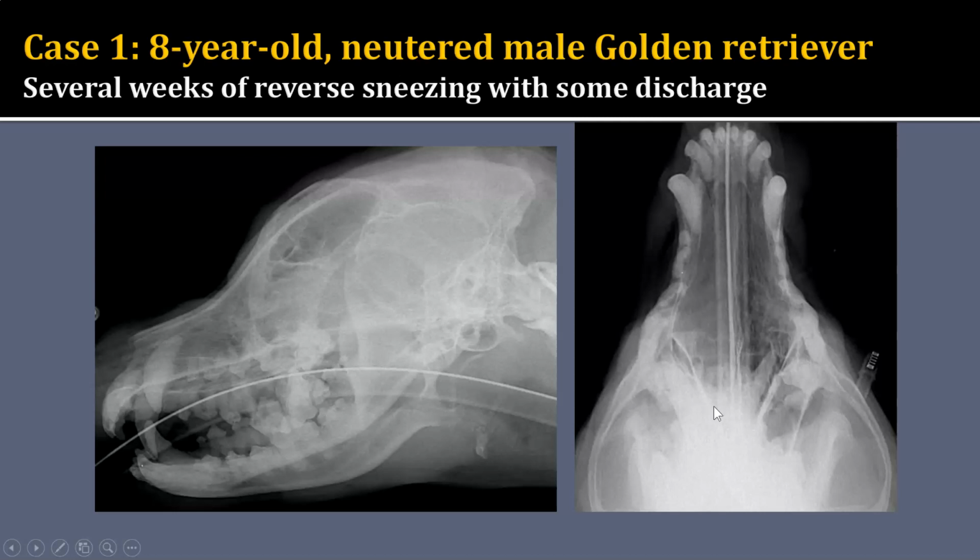And on this patient, I see that there is this kind of diffuse soft tissue opacity within the right nasal passage. In the mid to caudal nasal passage, it looks a little bit more uniform, whereas in the rostral nasal passage, it seems like it's a little bit non-uniform. And I believe that that's because this is probably fluid silhouetting partially with the soft tissue nasal turbinates. Remember, up in the rostral nasal passages, fluid can silhouette with the soft tissue turbinates.